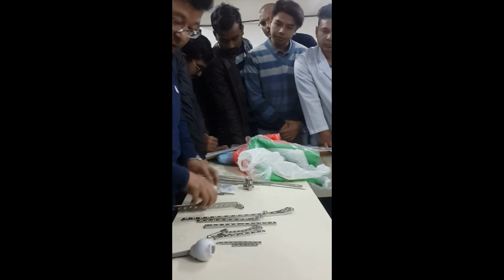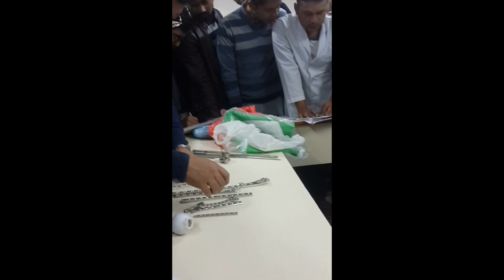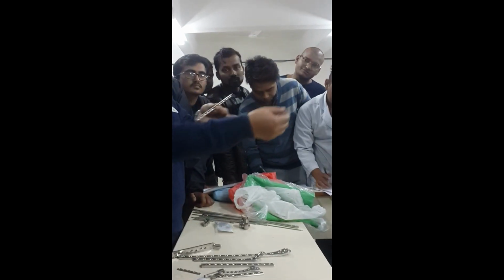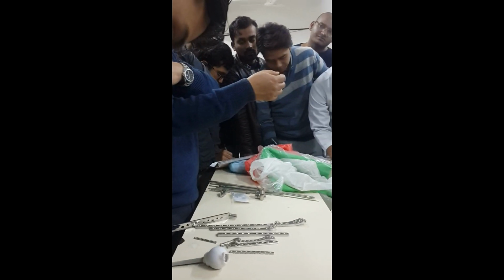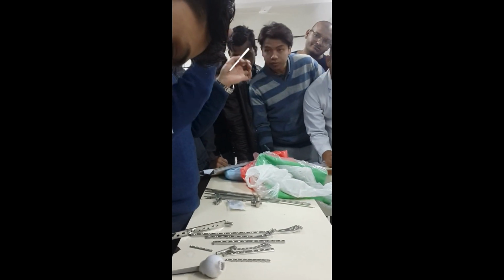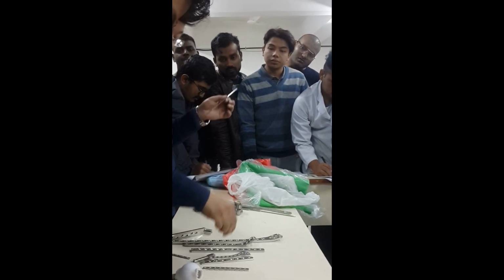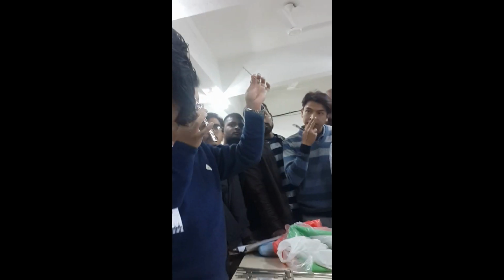So, okay, understood about DCP. And DCP, the various forms. This is the 3.5, which is used for forearm. For humerus is the 4.5, and 4.5 has two: narrow and broad. If you look at this, both are DCP. This is a 3.5 mm system. This is a 4.5 mm system.